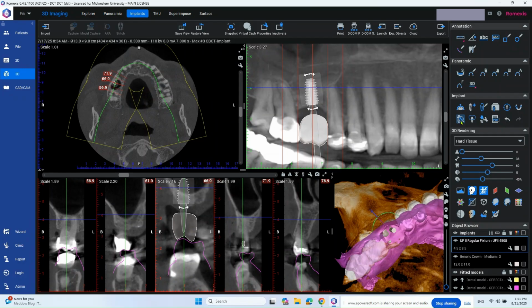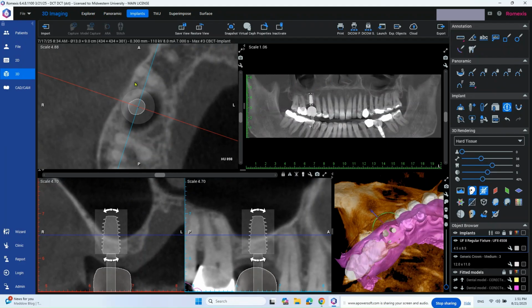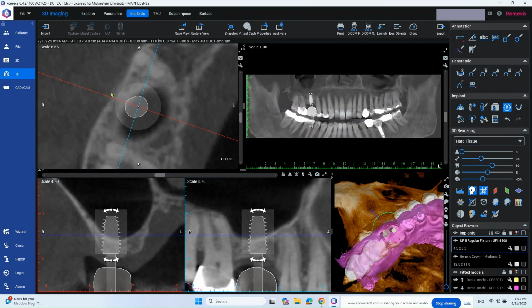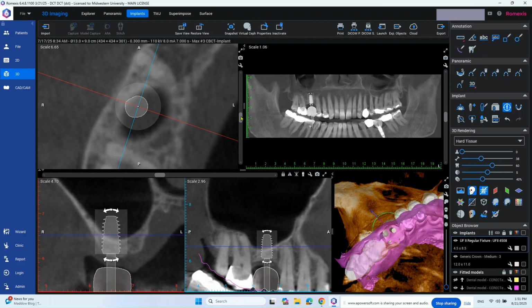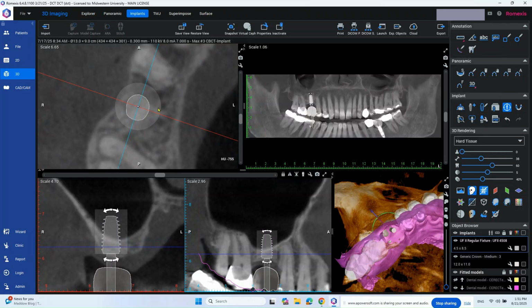Okay, one little tool that's really helpful to see that is what's called implant-centric view. You can capture it here where it looks like it's within this little sniper scope, or actually hit this button here. If you hit that, you're going to see the relative closeness to the buccal plate, how it looks in the sectional view, and basically everything looks good. It's just very close. As you come up, you can see the buccal plate drops in and is really close to that, which would cause some recession in the area and not favorable outcomes. So it's always good to really evaluate in this implant-centric view.